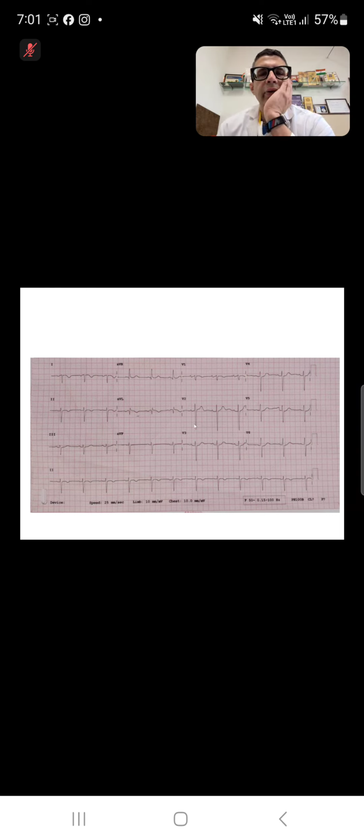Okay, so if you look at this particular ECG, you can see that L1 is totally negative and the P wave is totally negative. And in AVR, you have the P wave which is positive and the QRS complex which is positive. If you look from V1 to V6, you can see that there is a normal progression of the R wave, though probably the leads are not placed very well. They are still equiphasic by V6, but overall, the R wave is smaller in V1 and it's increasing in size by V6. So when you have this type of ECG, what are the differential diagnoses?